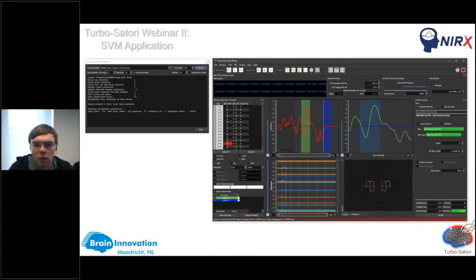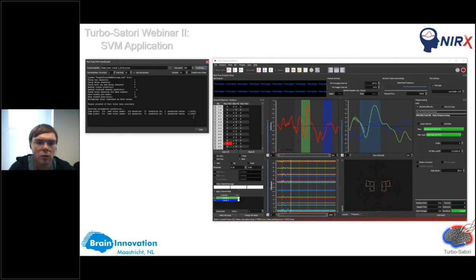Let's continue the data analysis. So now the second trial is over, and what you see is that for the second one, you get a strong negative value, meaning that this one is condition 2, or condition ID, including the rest condition, is in this case 3.